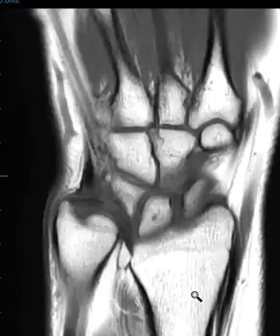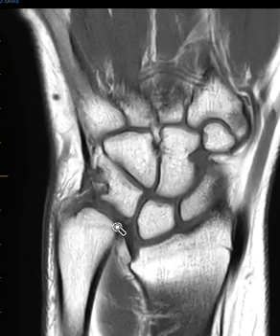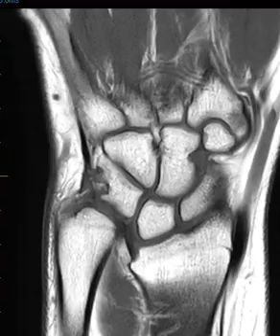This is a 16-year-old female who has had pain in her wrists for her whole life, and she has an abnormal appearance of the distal radius. So this is the radius, this is the ulna, and typically the radius is almost as long as the ulna, and normally the radius has a more horizontal articular surface, but hers is slanted downwards like this.